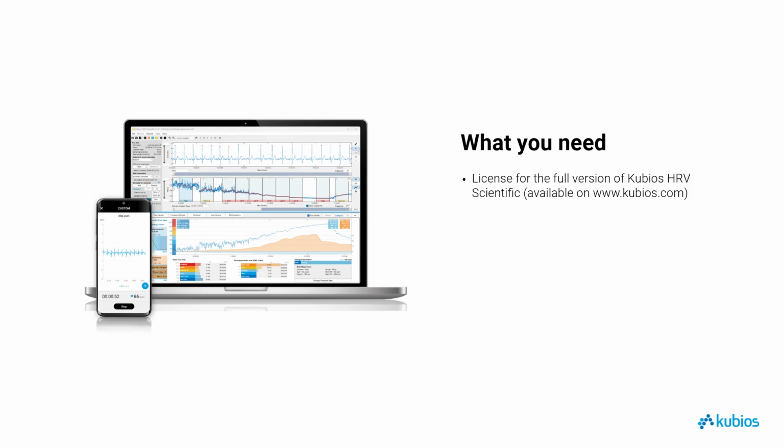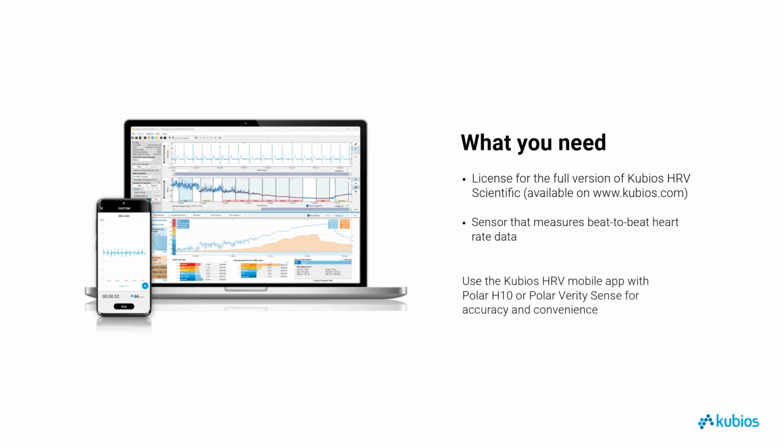Furthermore, accurate beat-to-beat heart rate data is essential. This necessitates the use of a heart rate sensor that supports this functionality. A convenient and reliable solution is to utilize the Kubios HRV mobile application in conjunction with Polar heart rate sensors, such as the H10 or Verity Sense.